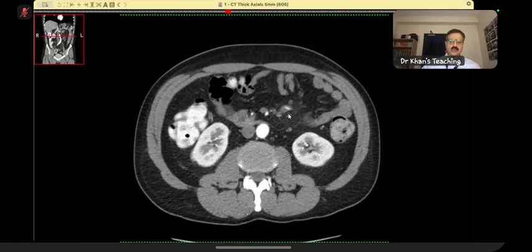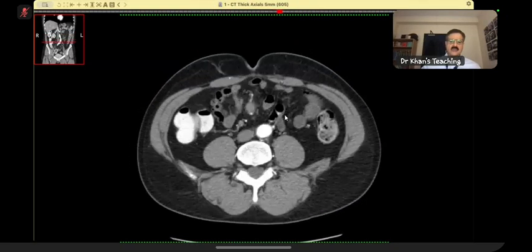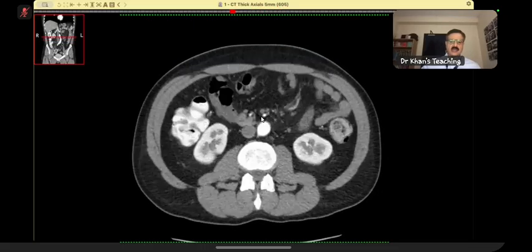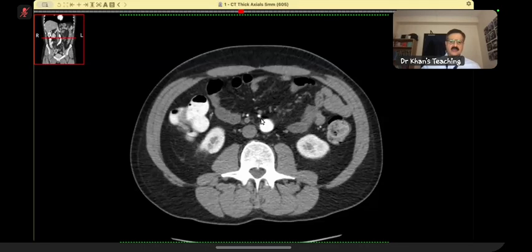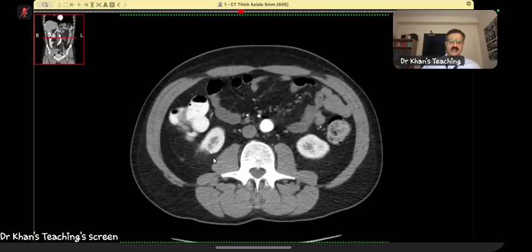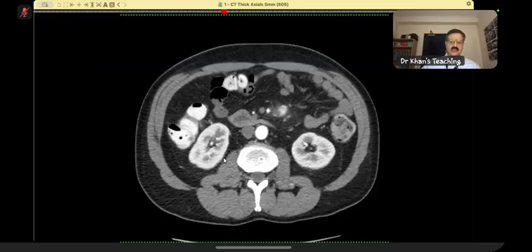Here, which has got a pseudoaneurysm. If we go in the mesentery inferiorly, we can see a thrombosed aneurysm. So this is historic, but there is no active bleed or aneurysm here. On the other hand, if you see this lowermost cut, you can see that there is a chronic infarction, and the cortex is irregular. So there is a chronic infarction.